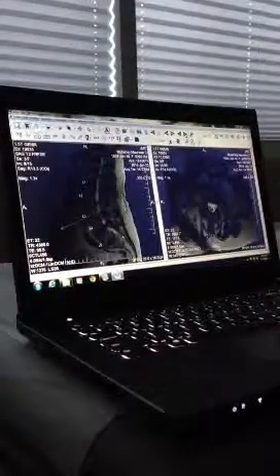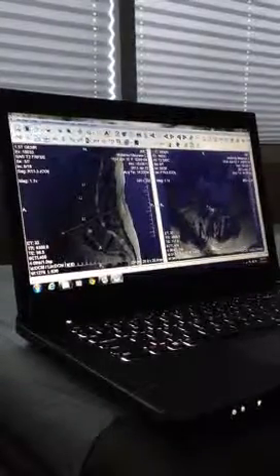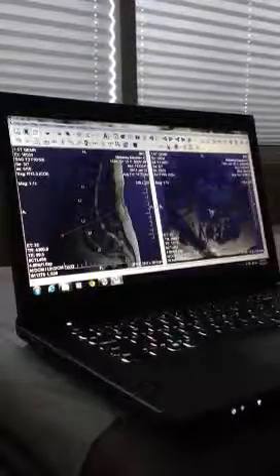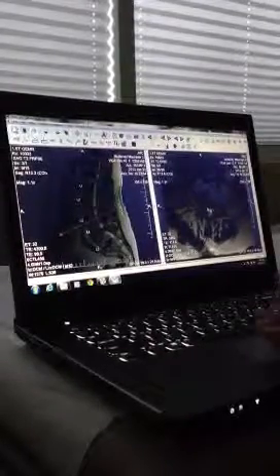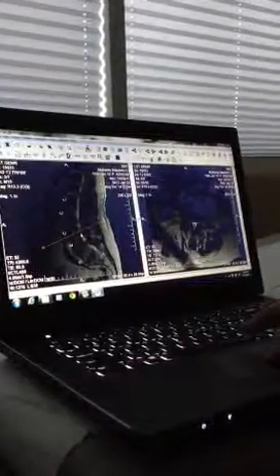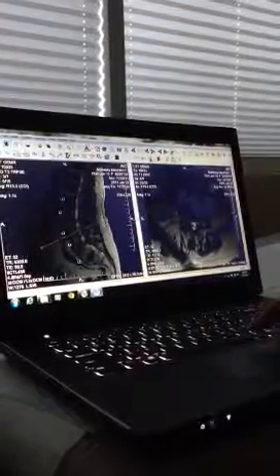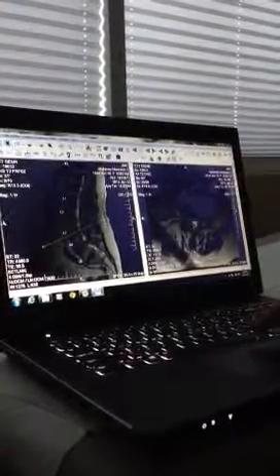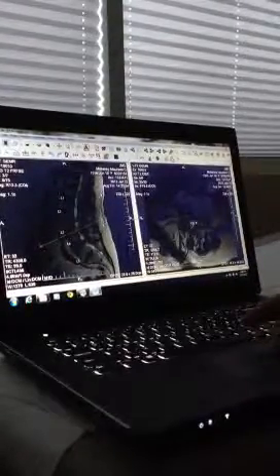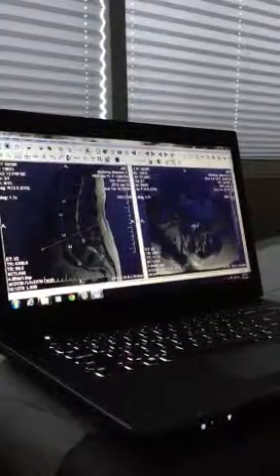We're going to go to L3-4. And I want to go to this level. Now you're going to say, well, Doc, I thought you said we had to be at the disc level. Well, there's a reason that I'm showing you this picture right here. This small black structure is a disc herniation. That disc herniation has actually migrated upwards, and that right there is the disc herniation. So that disc herniation has left the disc and it's migrated north.